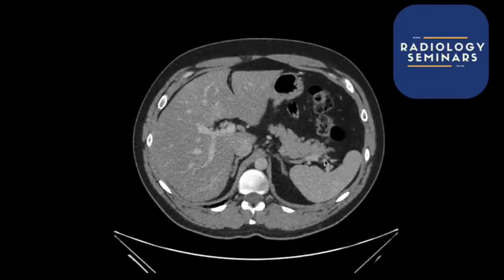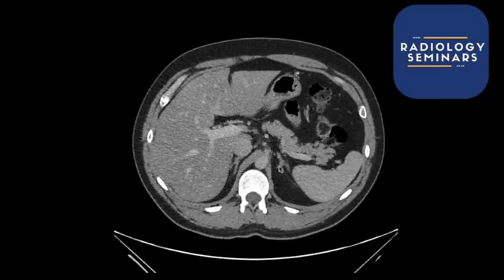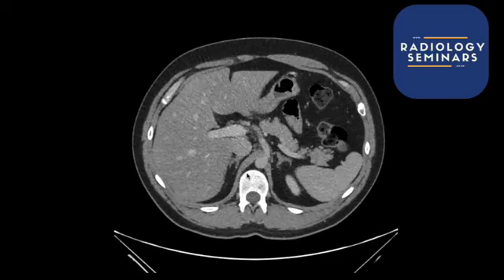Right, so we've done the liver, the gallbladder, the intrahepatic ducts, and we've gone on a bit about the pancreas. Next thing would be to look at the adrenals. The adrenal glands are these tiny little V-shaped things that are sitting here and here. They sit right on top of the kidneys, and they should be very, very thin. So you may have a bulbous appearance, it might look a bit thickened, and in those situations you end up getting a dedicated CT adrenal glands.